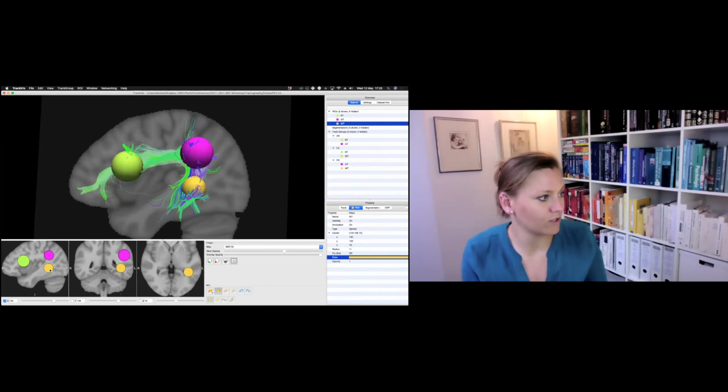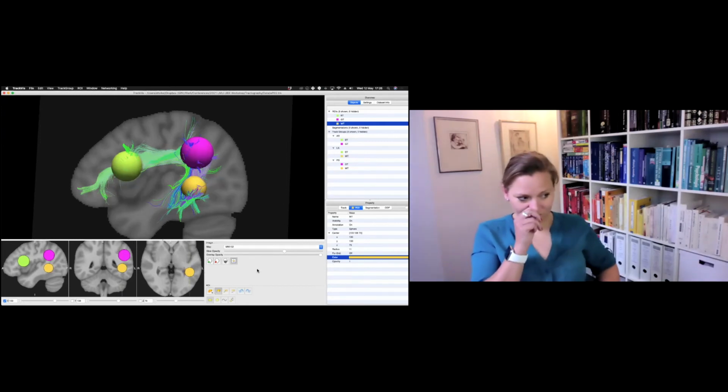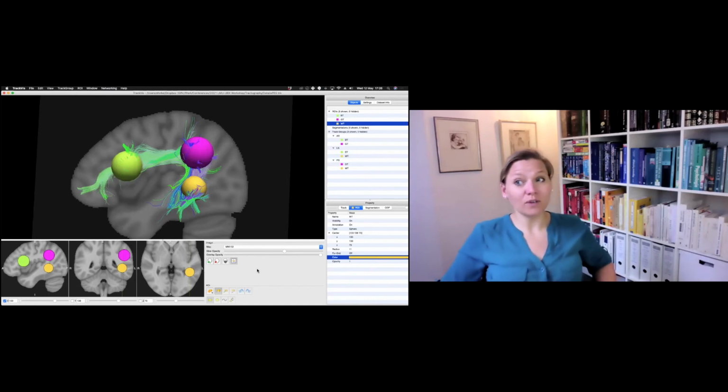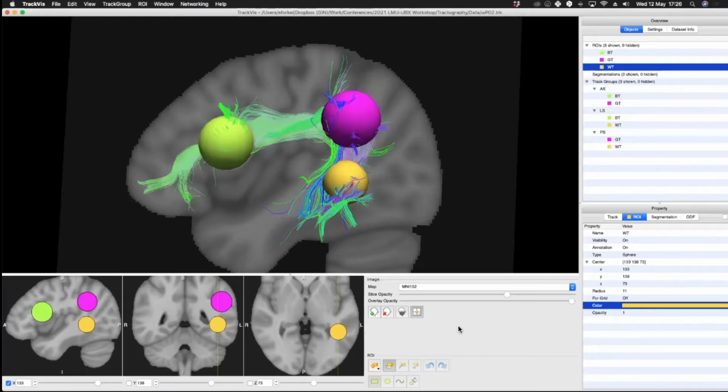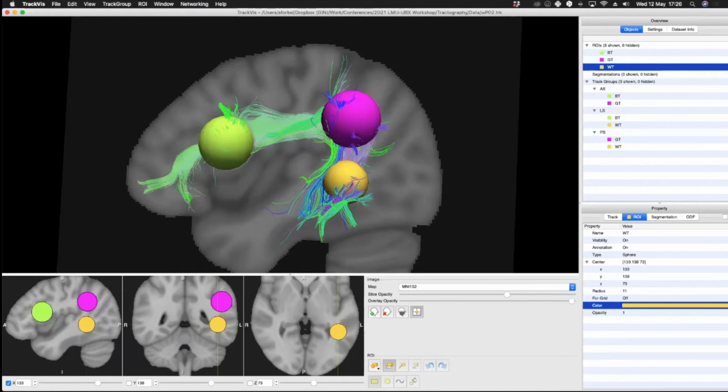to finish yours. Okay, no questions so far, no complaints. So I'm assuming you will see something akin to what I'm seeing on my screen. So now let's get this figure publication ready by changing it a little bit.